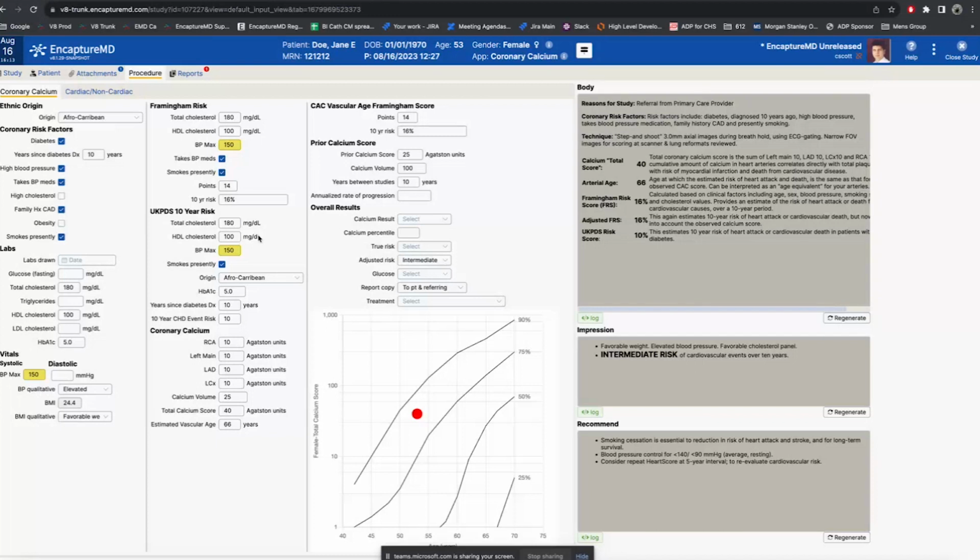So if you send an order, you're using DICOM modality worklist, the CT scanner picks up the worklist. If your scanner can output DICOM structured report information for the coronary calcium score, or if you do it offline, then you can populate here, then the report creates, and then it goes straight back. If the one that Tony showed earlier is already in PACS, but this one goes straight back. And from the user's perspective, none of that is going to matter to them. They're just going to sign this and move on. And I hope that answered that question.